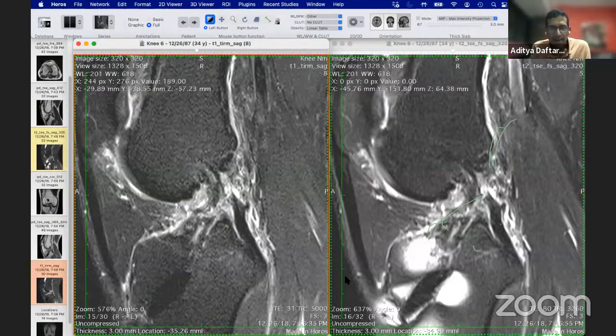Okay. Is there a way to look and quantify bony incorporation? Yes, there is. We can see better bony incorporation of the graft when it's harder and harder to separate the graft, the bone peg, from the adjacent graft. That's when you will see that there is bony incorporation of the graft.